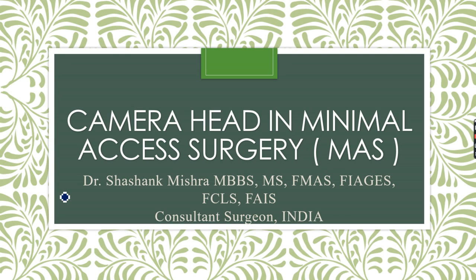The camera head and the camera source or analyzer are two different things. This camera head is attached to the telescope, and through this camera head, the signals go towards the camera analyzer or the camera source, and through that camera source or camera analyzer, the monitor is attached. So in this video, we are just focusing on this camera head, right?